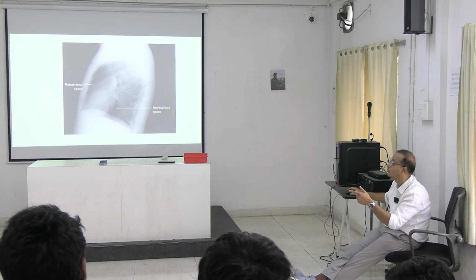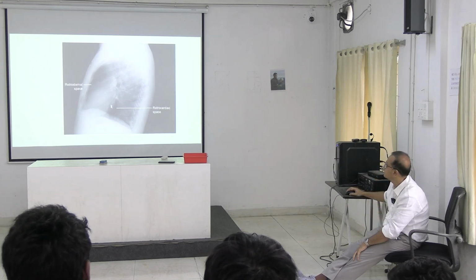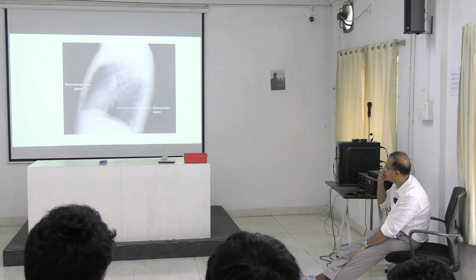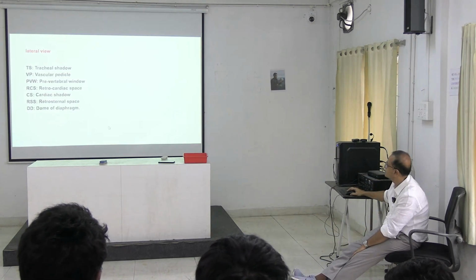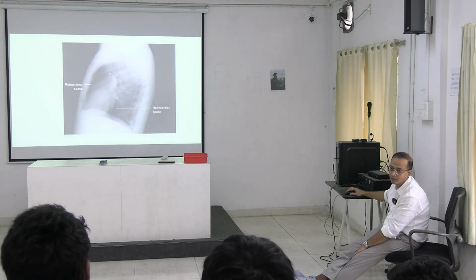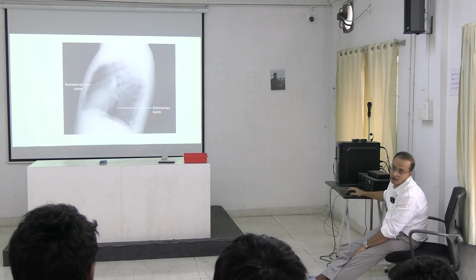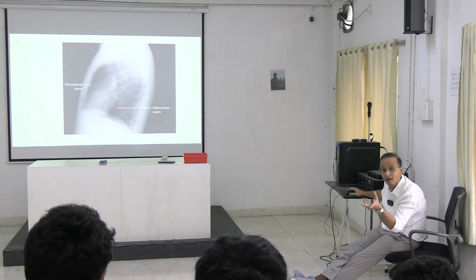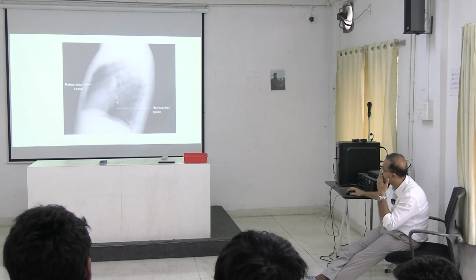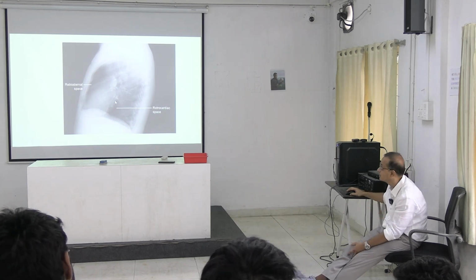In radiology, we call them retrosternal, and this one behind the heart we call retrocardiac. Now, once you see this, you can understand that this particular black shadow is because of this. Black shadow is for the lung shadows. This region corresponds to the cardiac shadows with pericardium. Clear? And in this region you see the bronchovascular markings. This is the same thing we are seeing.